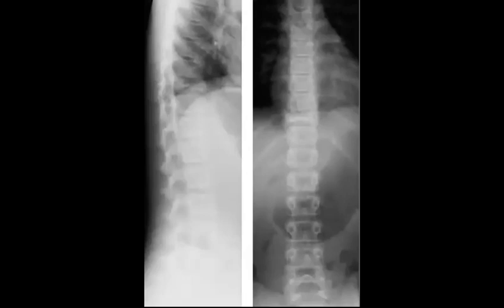So maybe they will ask you about the differential diagnosis of vertebra plana: eosinophilic granuloma, lymphoma and leukemia, trauma and TB. And finally, if it's an old patient, you can think about myeloma and metastasis. So the skull lesion that I want to show you is what is called a lytic lesion in the skull with beveled edge and button sequestrum.